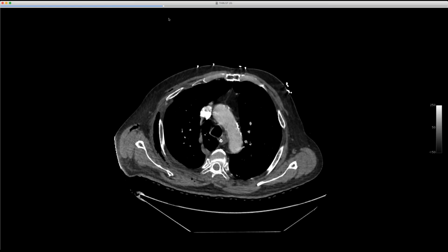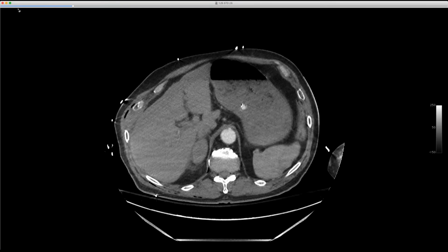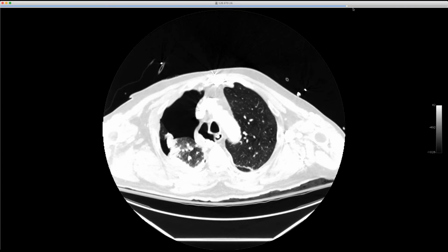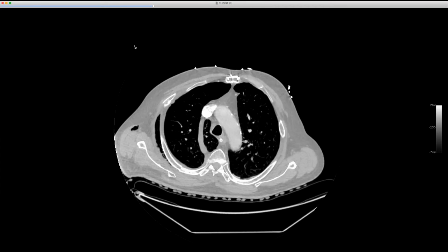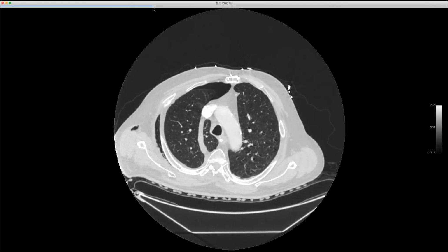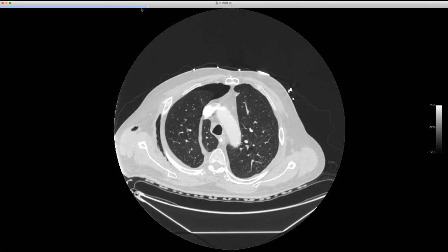We were talking about the azygous vein last week. This is a case where, this is the original scan. It was an acute traumatic injury, and we can see there's a big pneumothorax, and the azygous vein is hanging outside of the fissure, and the lung is pulled away from it. I thought maybe on the follow-up the lung would have come up and the azygous vein would have gone back to the mediastinum. But interestingly, as the lung came up, the fissure went back to where it was supposed to be. So this is the opposite of what we were talking about last week, and funny, because I came across this case right after we were talking.